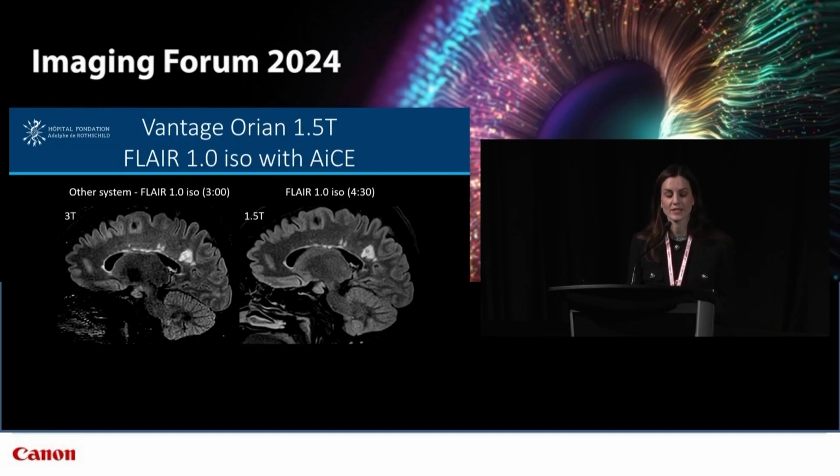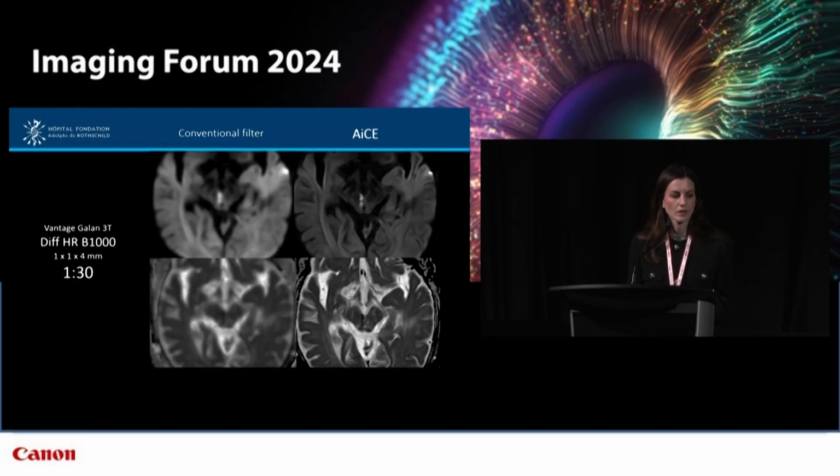And this is the same patient again, just to show you in the sagittal plane, and that there's no loss of diagnostic information having added ACE.